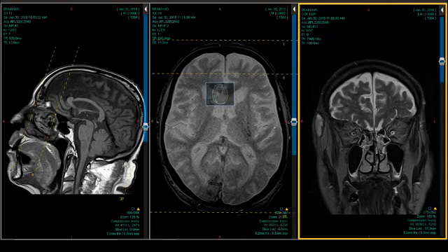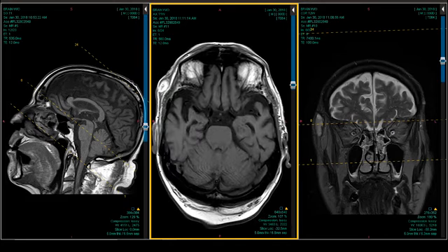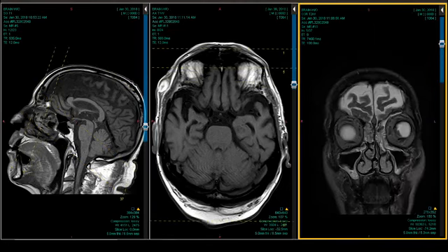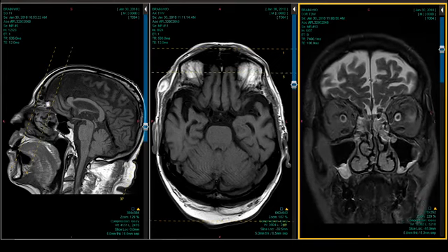And I'd go back. I'd check my axials, make sure it's blood. It is. It has methemoglobin staining. So putting it together, gait disturbance, hematoma, probably fell over. Just trying to tell the story, right? And the patient's got extensive sinus disease with occlusion of the osteomeatal units. While you're looking, I'll give you some editorializing.